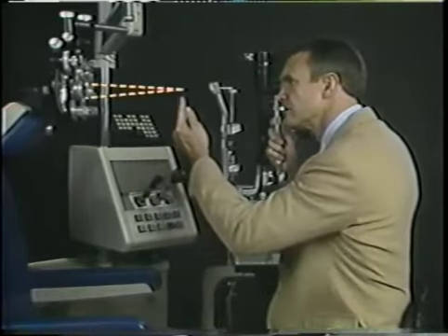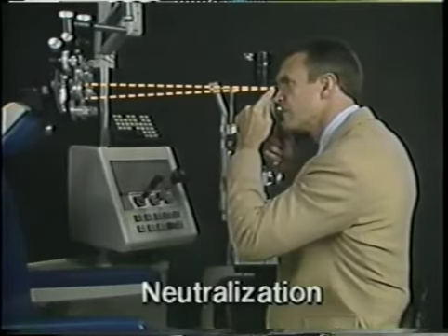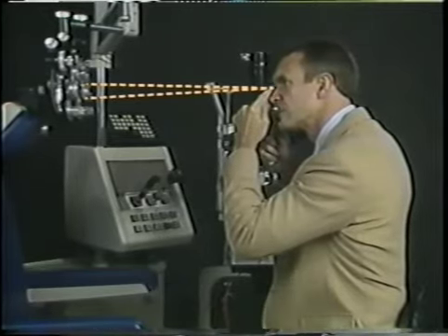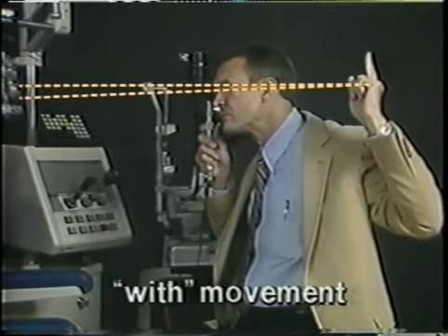What determines whether one sees with movement, against movement, or neutralization is simply where the eye is focused. If the eye is very nearsighted and is focused between the phoropter and the retinoscope, you will see against movement. If it is focused at the peephole of the retinoscope, you will see neutralization, that is, no movement. And if the eye is focused anywhere else, for instance, behind the retinoscope, you will see with movement.